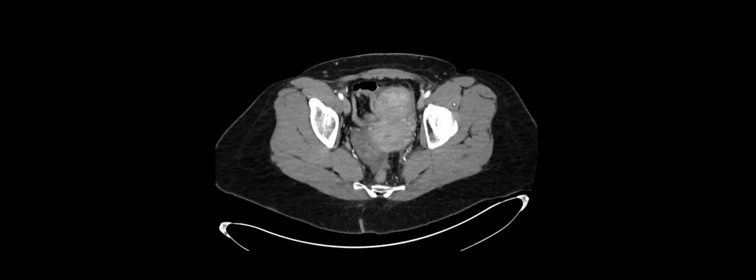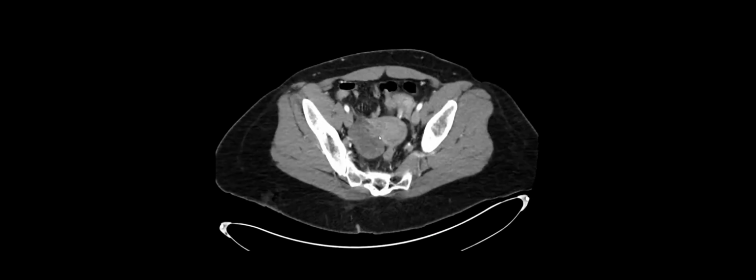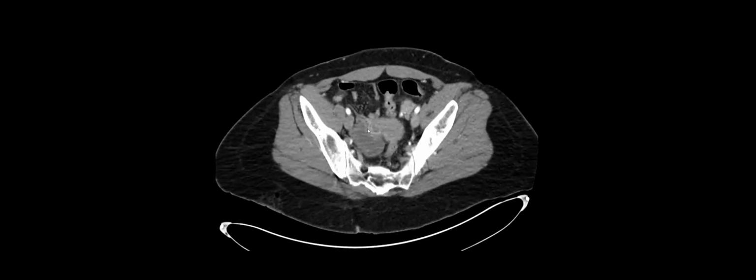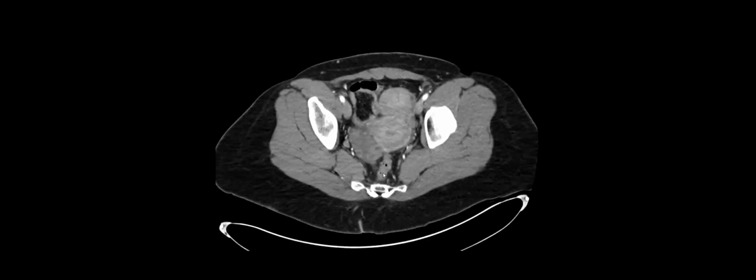There's that swirling sign. Yeah, exactly, right there. You see a swirl right there. I'll show you in the coronal too, but it literally is swirled. And then if you narrow these windows, you can see those peripheral follicles, right? And then the location of the ovary changes. Enhancement too is hypoenhancing. Exactly.